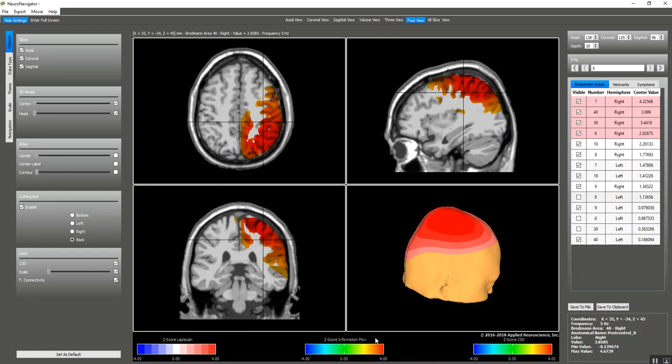So this is a quick view of the NeuroNavigator as it's updated. You'll get an immediate view of what level of deviation from normal there is as you move your mouse in the lower any of these scales. And you can adjust the deviations from normal. This is information flow. And the labels change as you change the particular items that you're looking at.